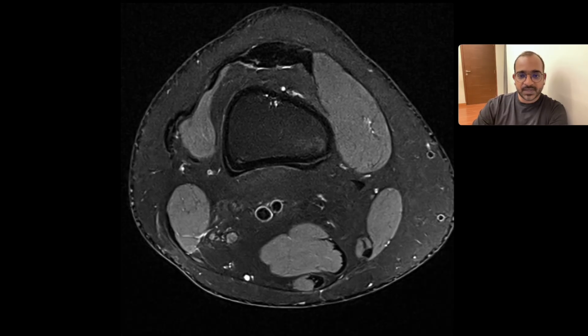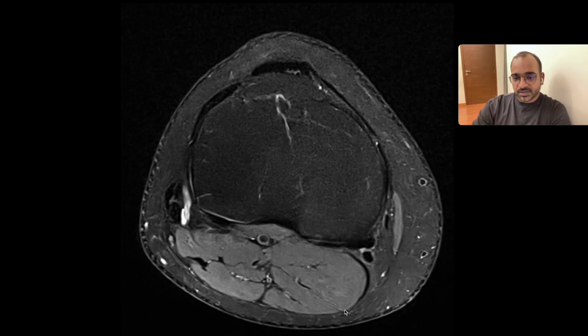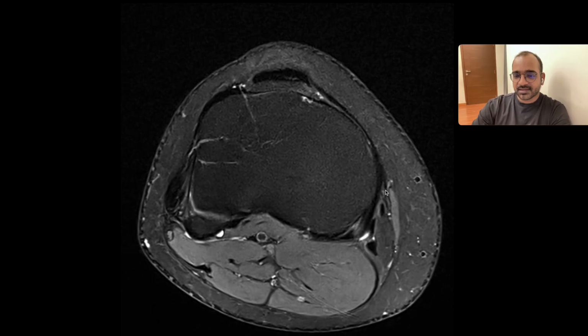Then coming to the medial aspect, I'm going to show something on the axial sections. So if you see here, what is this? This is the bursa. Usually in case of osteoarthritis, and sometimes because of repeated shear strain, people will experience pain in the medial and posterior aspect of the knee, just below the knee joint. So this is a pes anserinus bursa.